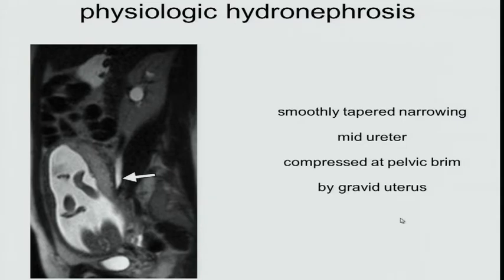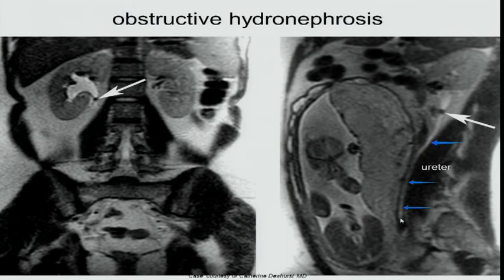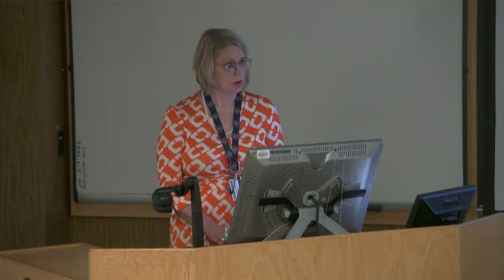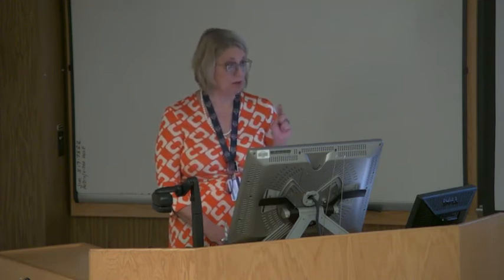Okay, so here's... Dr. Wilson, with the obstructive hydronephrosis, you may discuss it further on in the lecture, but treatment options? They are tough to perk because you can't put them on their tummy, but I have had to perk some. We're going to put a double J stent there and let the stone pass. Okay. When it's that size. Okay, and yes, sir. So, you guys remember for sizing calculi, they usually use like 8 millimeters. Is that what they use here? What's that? They usually use 8 millimeters.